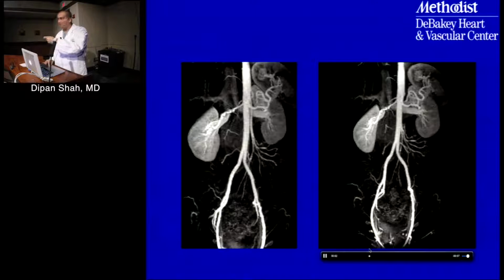So I think Bashar commented he thought there was renal artery stenosis on which side? On the right. On the right. And how would you describe this stenosis? So, proximally, right at the origin. Okay. Yeah, so if you go further out, that exactly. See, if you go further out, right here is where the abnormality is. You see kind of this beaded appearance, right? So that's the primary pathology here.